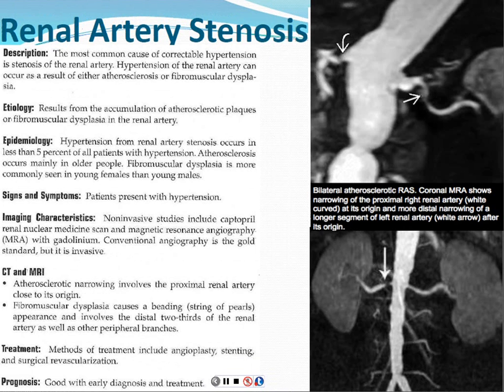These images are showing renal artery stenosis. Atherosclerosis can affect the small vessels as well as the large vessels like the aorta. So the renal vessels are at risk of being narrowed and eventually occluded. Naturally, if your kidney is not getting enough blood flow, it's going to start to become atrophic and it will shrink down. It won't function as well. So this is a cause of renal failure. It's also, before it gets to that point, an important cause of hypertension that can't be controlled with normal means.